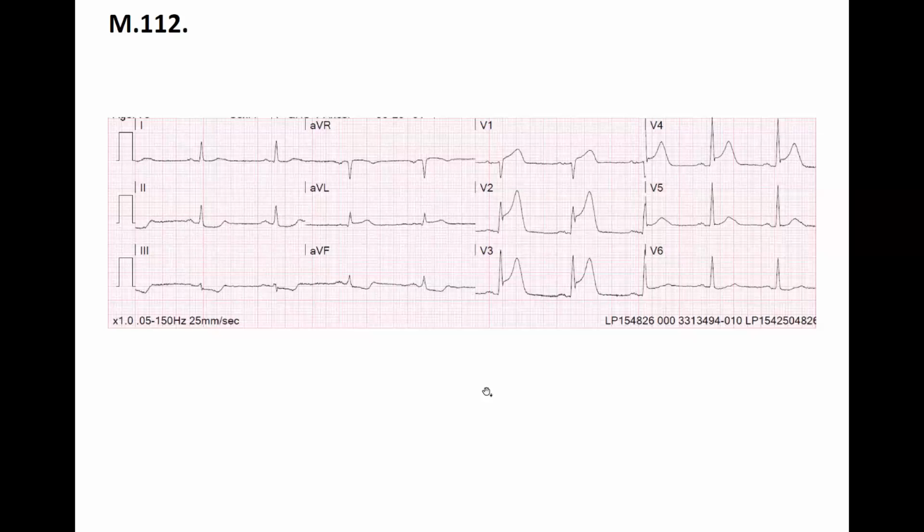To decide hyperacute or acute is good for deciding whether you use a stent or thrombolysis or any therapy to dissolve the clot. Depending on the stage, of course, the Q is deepening and deepening when the necrotic area is getting bigger. But this is only the anteroseptal STEMI. You can see it in this situation.